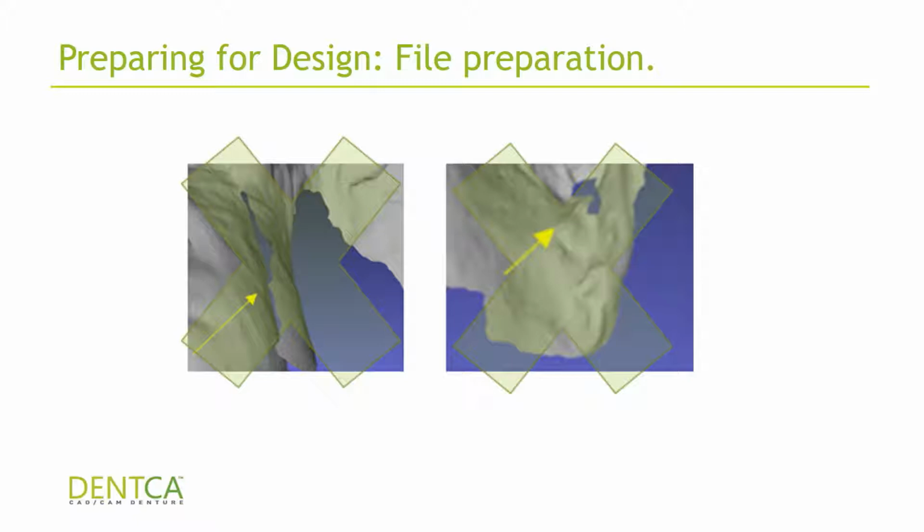Next session, we're going to be talking about the best practices for record taking, so keep this information in mind for the future. Also, it's very important to make sure that the impressions we're going to be using don't have any holes in them. If they have some holes, they need to be patched up.